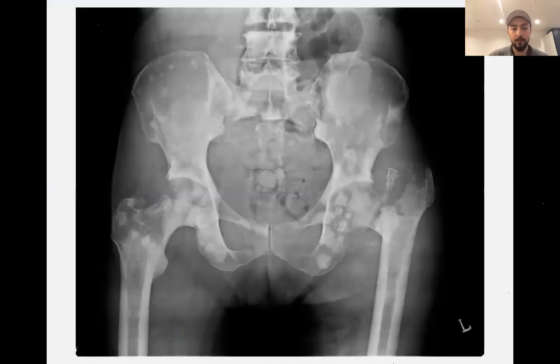As we know, we finished the first B, now the second B, bones. After going through the intestines and the colons, you will have to look at the bones quickly. Obviously, the most important thing is the first B, to make sure the bowels and the visceral organs are normal. After you do that, you look at the bones. You can see this bone is clearly not normal.